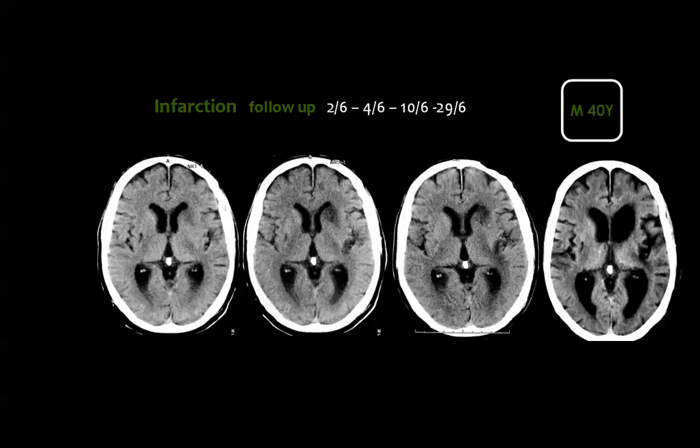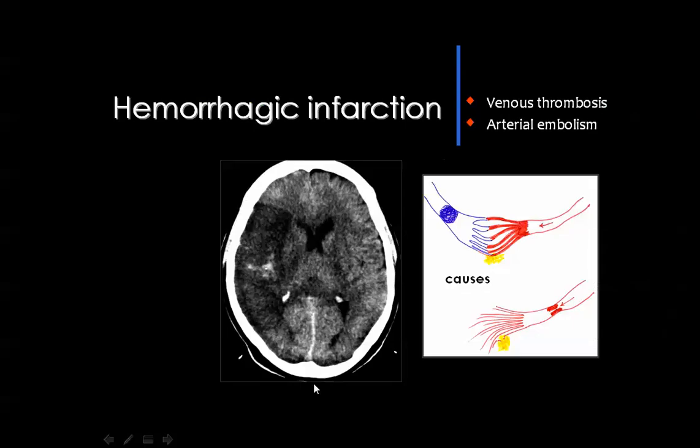And this is the case before the era of MRI, and you have to look at the infarction every now and then. This is an acute infarction with the mass effect, and after some time you get a chronic infarction with a dilatation of the ipsilateral ventricle. Sometimes you may have an infarction with internal hemorrhage, and this is an infarcted area with foci of recent blood.